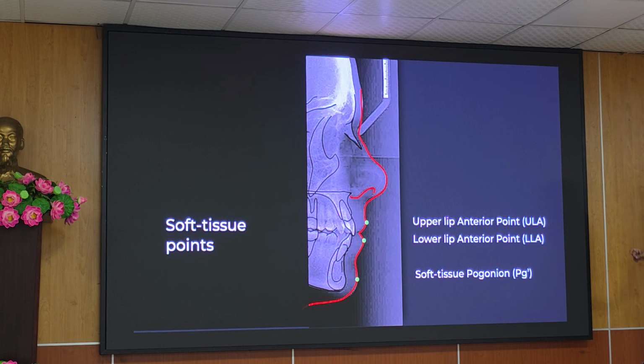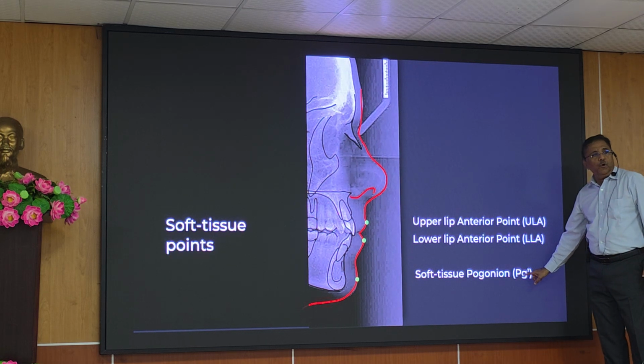So that's the point PG dash. Then we also call it POG, pogonion.